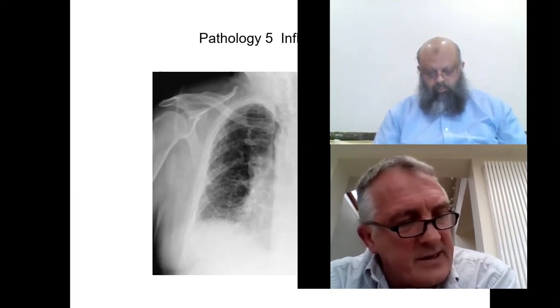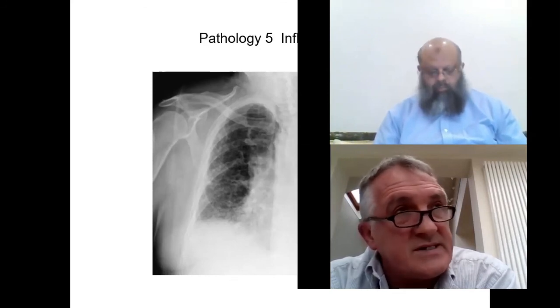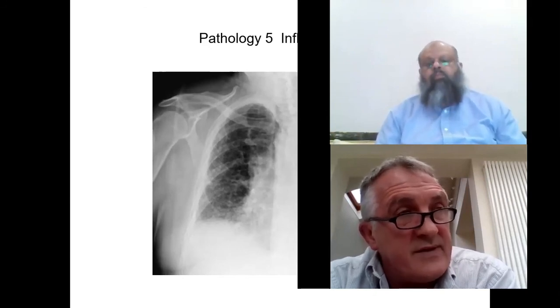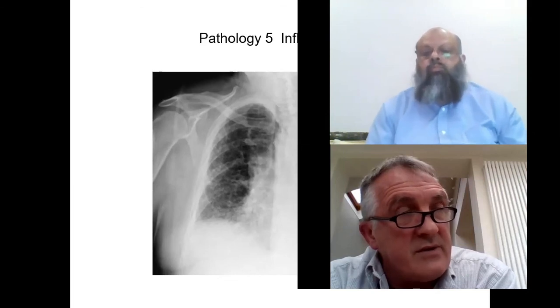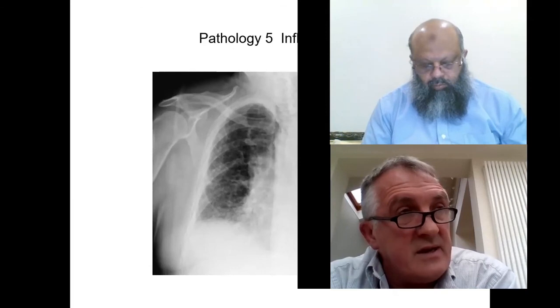And so we put these very standard X-rays in our teaching packets, because I can differentiate a good candidate from a bad candidate by just a pleural effusion. I know the candidates are desperate to see really rare things and be challenged, but the FRCR exam certainly is not about rarity. It's about doing the standard, the common things, very well. And that's what we're looking for. It's all about safety.